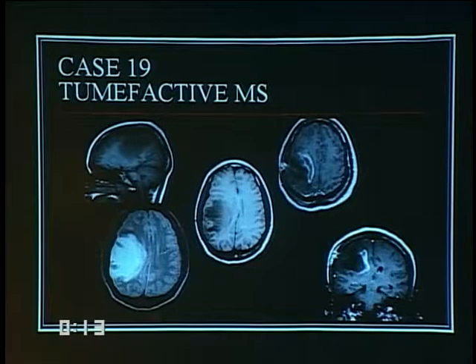This person has what looks like tumor, very large, high signal region, low signal on T1, looks like lots of edema, but we don't really see an enhancing mass in the center of all of this. You wouldn't expect just from this degree of enhancement that if this were a neoplasm, which really doesn't look like that nice round tumor, if this was neoplasm, you would expect that the edema would be all the way around it rather than extending outward in this type of fashion.